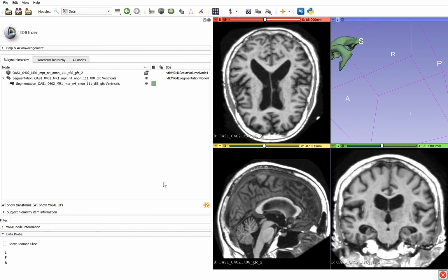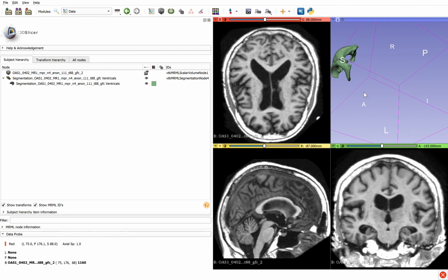Okay. So the first thing you see, and some of you may have noticed this, is that the segmentation over here, if you try to load it back in, it doesn't appear anywhere near the actual brain. And the reason for this is that for some reason it's saving the coordinates backwards and then reloading them in backwards. Remember how there's that coordinate choice that we had to make? For some reason that didn't save out correctly. I don't know why. If for some reason you open it up and it does just sit perfectly over where you expect it to, then don't worry about this next step.